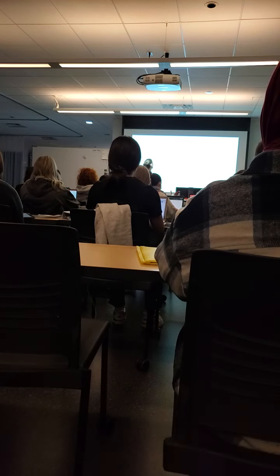Okay, so we're going to see some low-level echoes with mobility. We're going to have that fluid level, and this can be an entire gallbladder full of this, or it can be just a very small layer at the bottom. And the smaller the volume, the harder it is to see, because you're like, is this just the bottom of the gallbladder wall? So you go to the patients and you realize it was sludge.